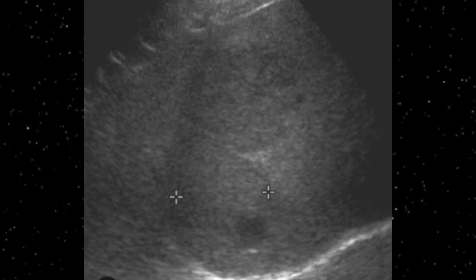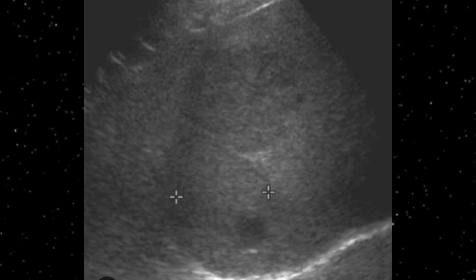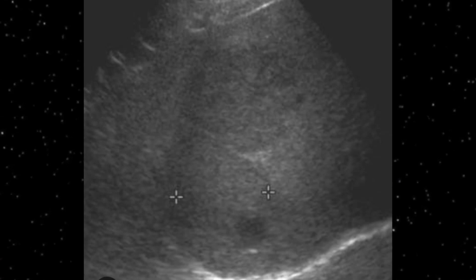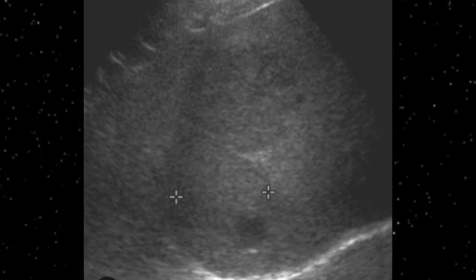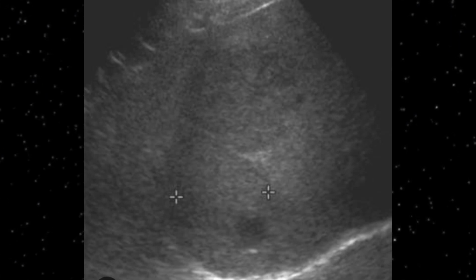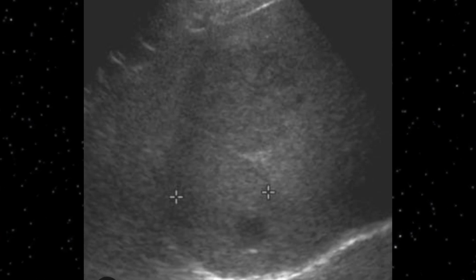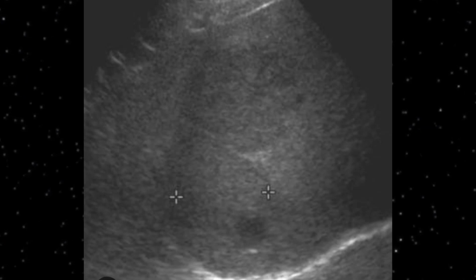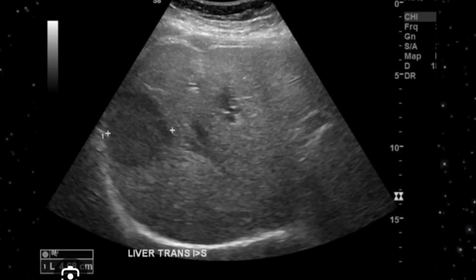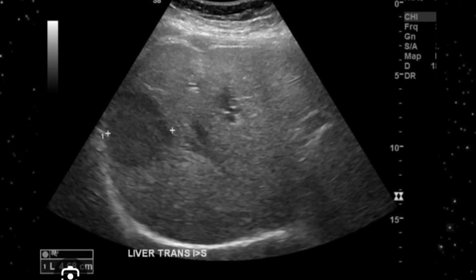These are two confluent nodules. If you see, they are sharing the boundary with each other, and there is no central scarring, no cystic degenerative changes, and no calcification in it. The surrounding vasculature is not visible clearly on this image. If it were visible, it would definitely be displaced because of the mass effect of these two large hepatic adenomas.